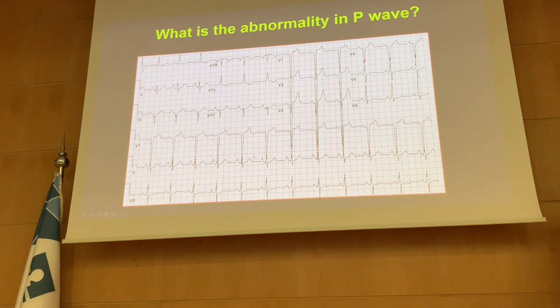So now, come to the other scenario. Young, remember young boy, he's 14 and he's coming with high JVP. Her mother noticed the neck is engorged. Okay, she brought him to the hospital. He's not complaining anymore. And the cardiologist auscultated his chest and he heard a diastolic murmur on the right side, increased with inspiration. And this is the ECG.